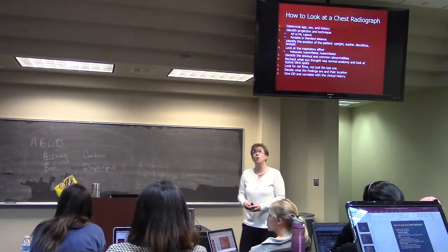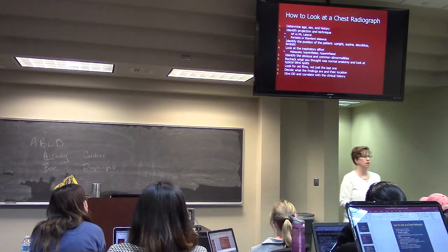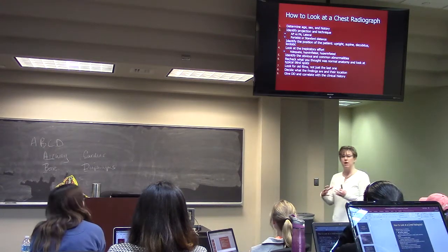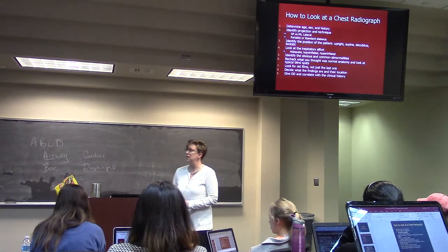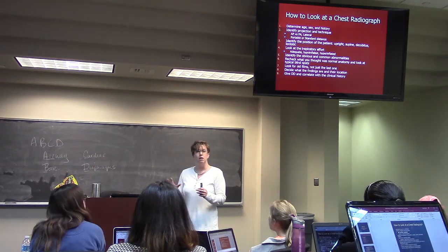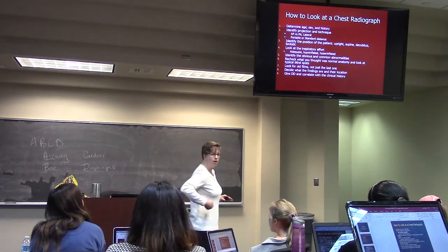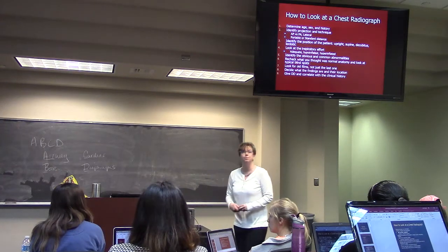You want to look for things behind things. What does that mean? Well, the heart's not the only thing in the chest. There's things that sit behind the heart. There's things that sit behind the diaphragms. If you think anatomically, your lungs aren't just straight across, right? They sit behind the diaphragms. Okay?